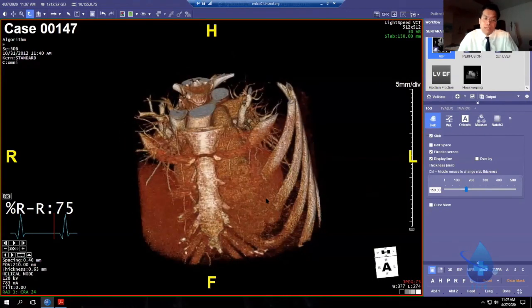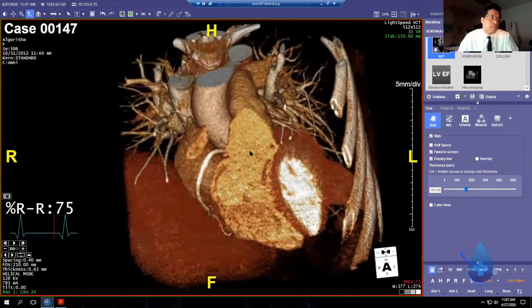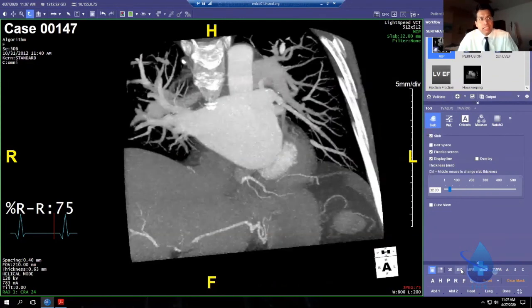And tomorrow I'm going to pimp you guys, and I'm deliberately setting a few traps for you to fall into, and you're going to use color and you're going to miss the diagnosis, and then I get to yell at you and say, listen, never trust color. We make all our diagnoses in black and white using MIPs and MPR. Now let's dive, well, that's actually it. That's it for all the buttons you need.